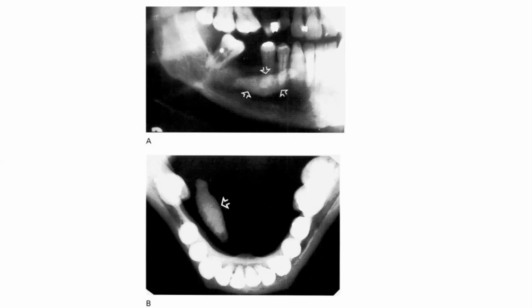We also have calcified lymph nodes, which we can see here, especially in the lower left quadrant. The calcification of lymph nodes is relatively common following chronic infections like tuberculosis. It's basically a formation of scar tissue.